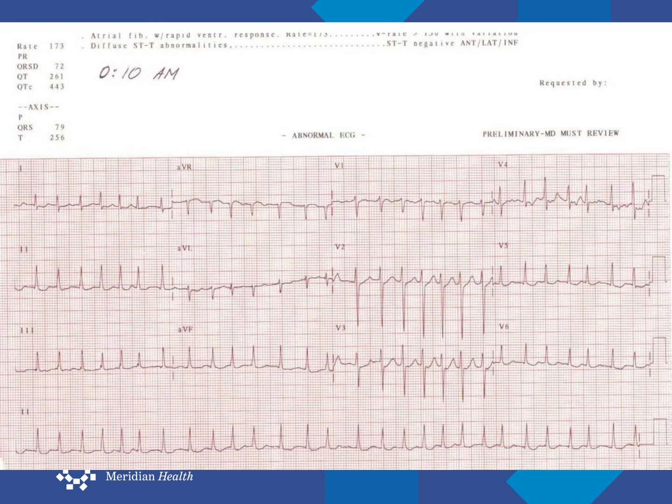The key to identifying this rhythm is to notice that it is irregular. This is atrial fibrillation, and it's common in older adults. We usually slow it down with diltiazem, although there are some instances in which we might try to convert in the emergency department. Usually this requires previous anticoagulation and depends on how rapidly the onset has been. Recognize this rhythm from its rapidity and its irregularity.